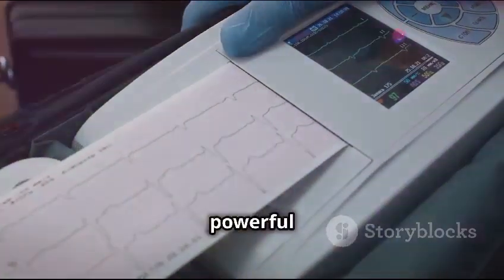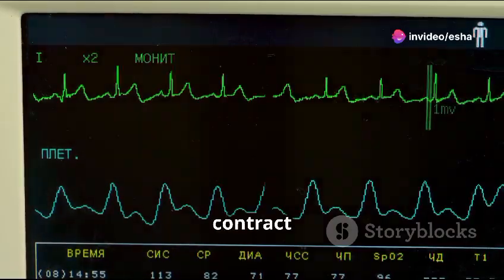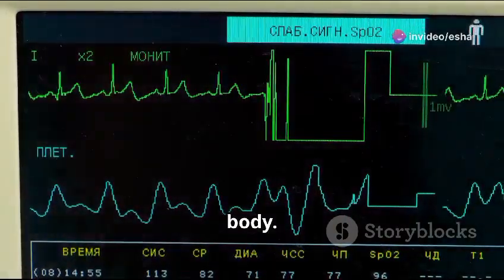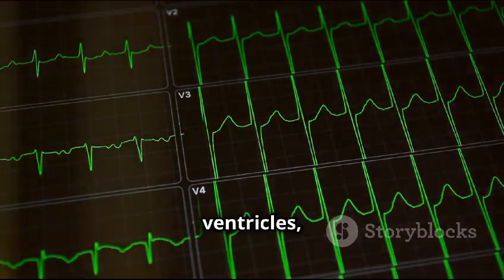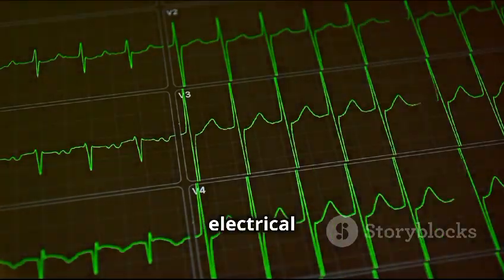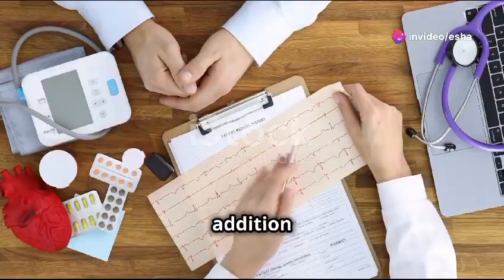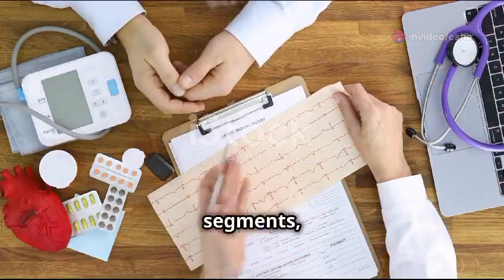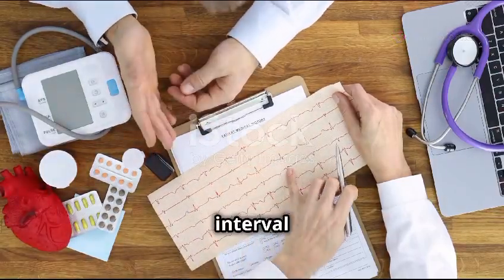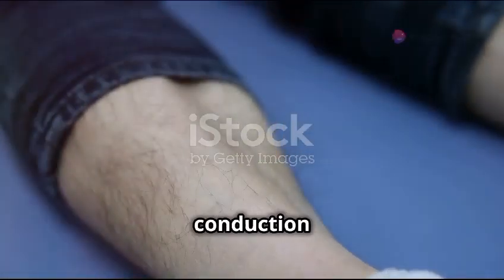This is the most powerful part of the electrical signal, as it causes the ventricles to contract and pump blood to the body. Finally, the T wave represents the repolarization of the ventricles, a period of electrical recovery before the next heartbeat. In addition to these waves, the ECG also includes intervals and segments, such as the PR interval and the QT interval, which provide information about the timing and conduction of the electrical impulses.